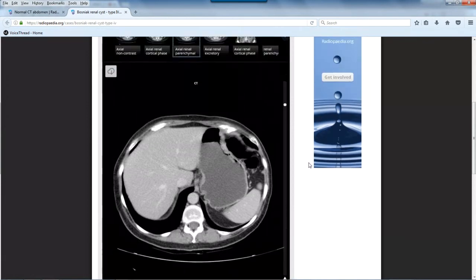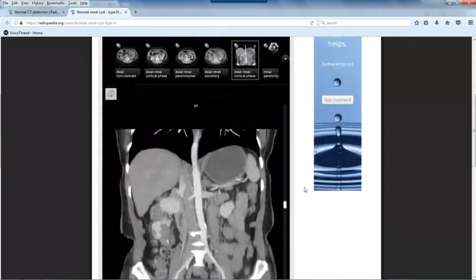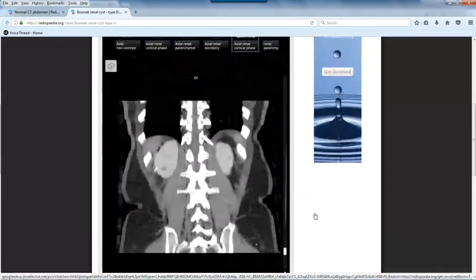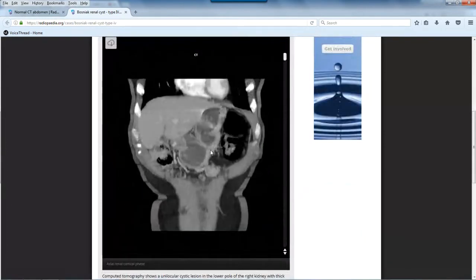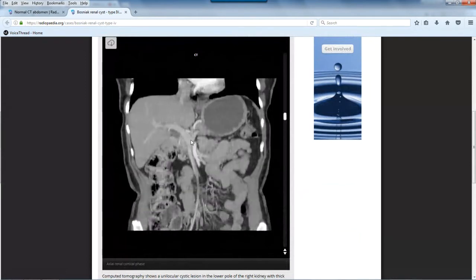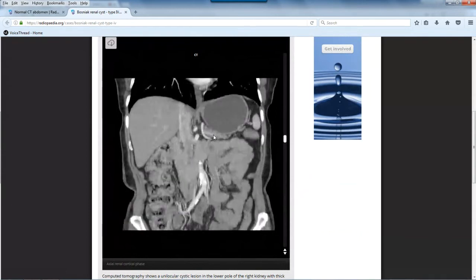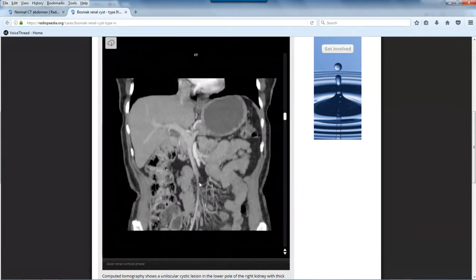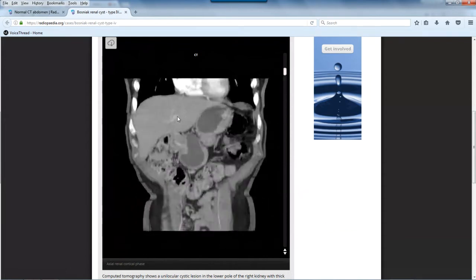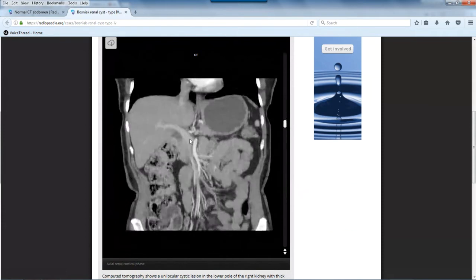And again, we can also try to see that. Let's look in the coronal view. So let's center this. Let's start all the way in the front. And see, this is kind of sliced off. Here's your portal system right here. There's your portal vein, your splenic vein that's come across here. Superior mesenteric vein, and then your portal vein. Your right portal, and then there's your left portal vein. Okay.